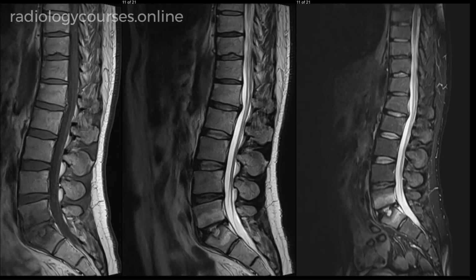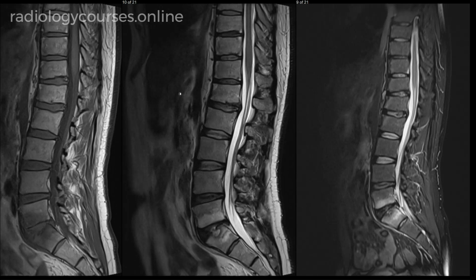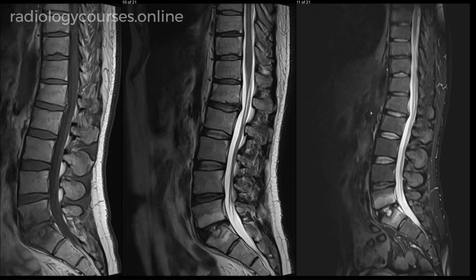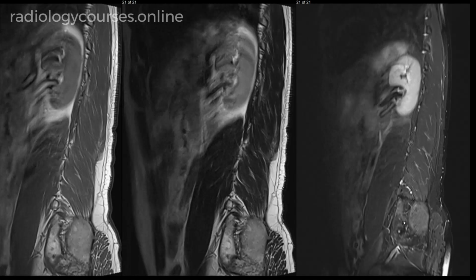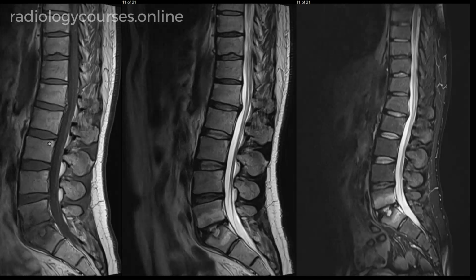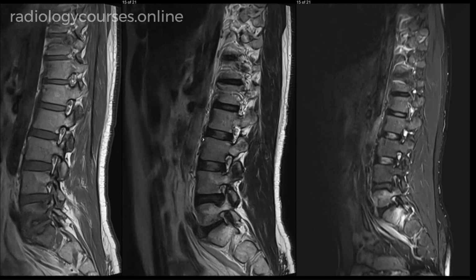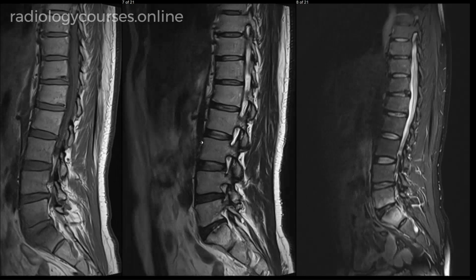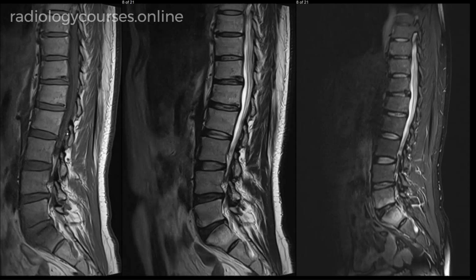So now, combining all three features, that is Modic type 1 end plate degenerative changes, both active and inactive inflammatory corners in the vertebral body edges, and high suspicion of bilateral active sacroiliitis, features are very likely to represent active inflammatory spondyloarthropathy, such as ankylosing spondylitis or secondary to known inflammatory bowel disease.